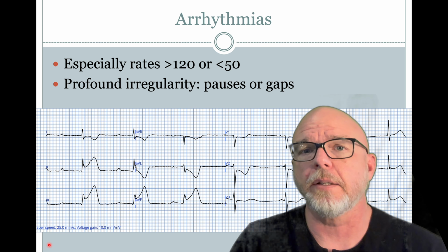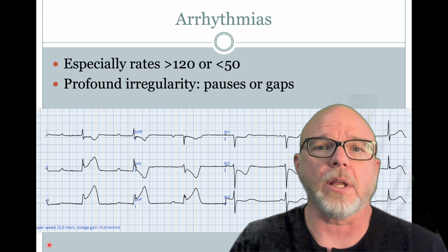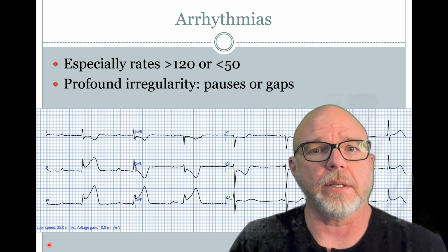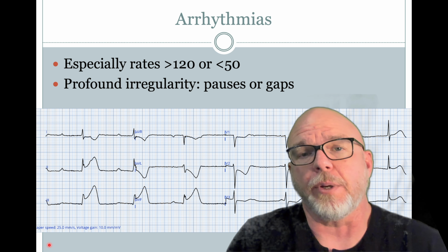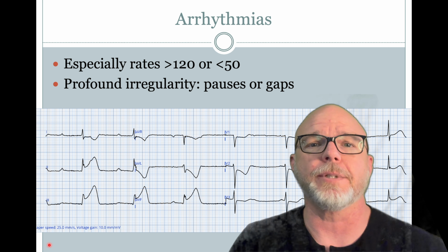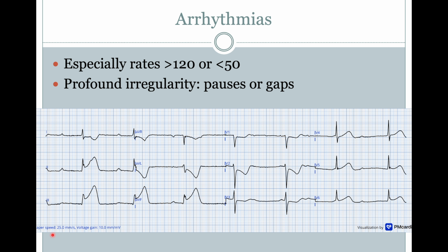Another time when they matter, a kind of relative to the especially slow, is extensive pauses or gaps within QRSs. Those can cause a loss of consciousness as well. And if we find those, we get to hit print, we get to take that to someone that's going to provide them definitive care, and we have proof. In this case, the rate is about 43 on the screen.